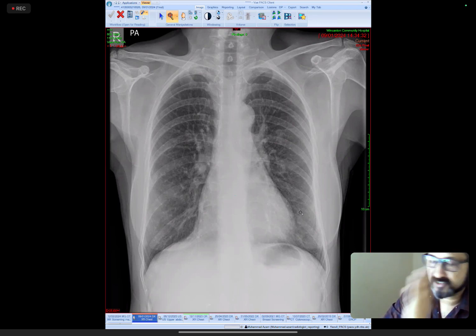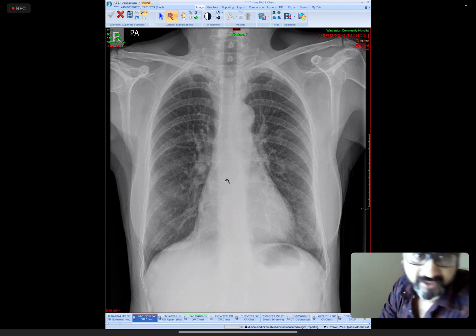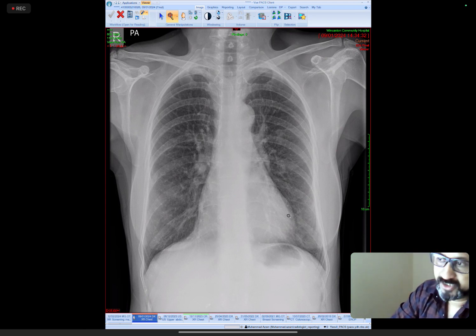Absolutely crystal clear abnormality which 10 radiologists could see, that would be an abnormality. Should it be displaced and non-displaced? Not really. Good question, not really. Even if you are saying fracture, site and area and good anatomy would be sufficient enough. So this is normal, absolutely normal.